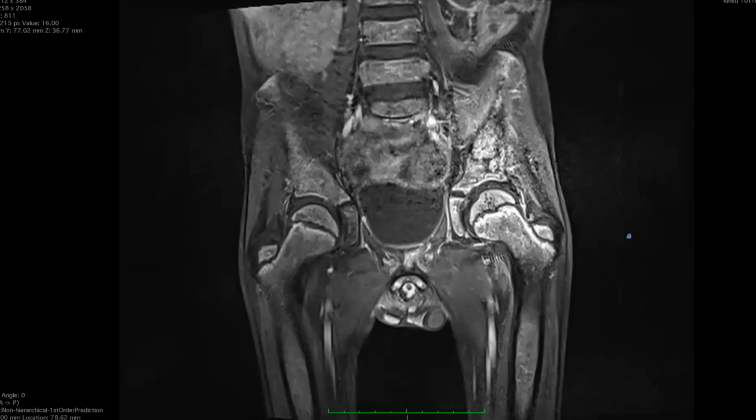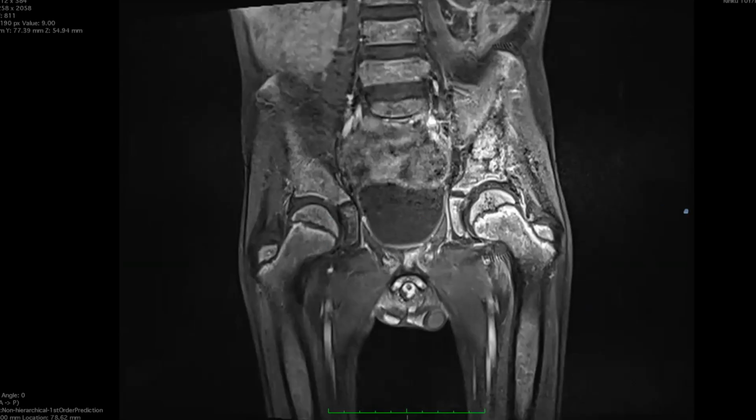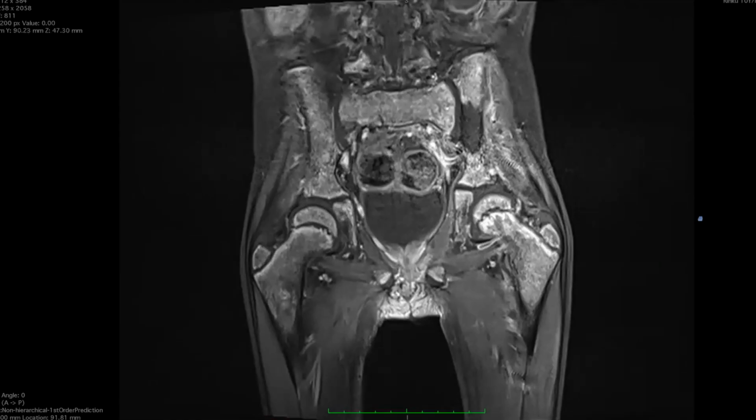So you mentioned that the patient has to go to the hematology MDT. That was right. You mentioned that you would like to rule out a sickle cell disease. So if you have one particular sequence or a scout image, you rule the particular diseases in your differential in that particular image. So you could have said that there is no H-shaped vertebra or there is no AVN. So you could have ruled that out. Clinically in the MDT, you also should have gone for a bone marrow, and this also needed to be assessed on a bone marrow aspirate or a biopsy. This came out to be pus, and this was actually a fungal infection.